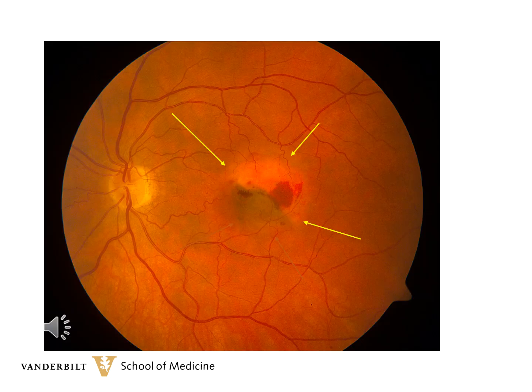Here is a 70-year-old male who has an RPE rip. He had a sudden loss in the left eye about 1 month prior to presentation. His vision is 20/200. The yellow arrows point to the border where the RPE detachment was before it ripped. The yellow area inside of the arrows is bare choroid. The brown arrow points to the curled up RPE.